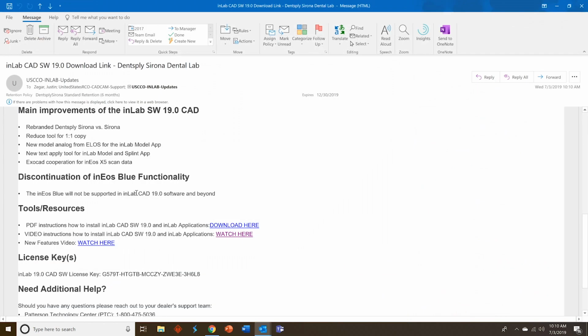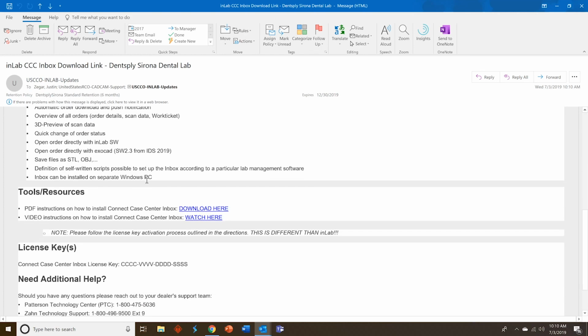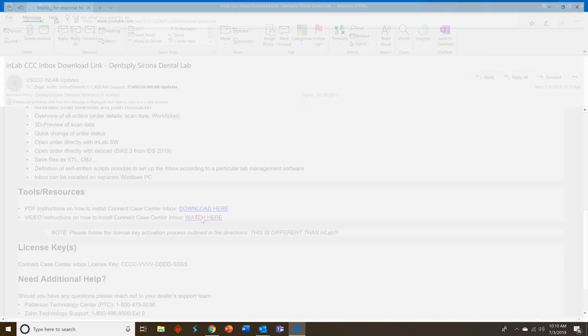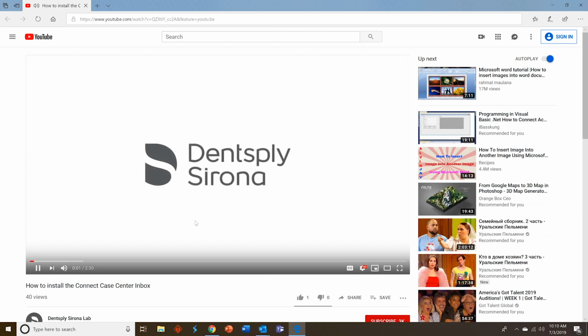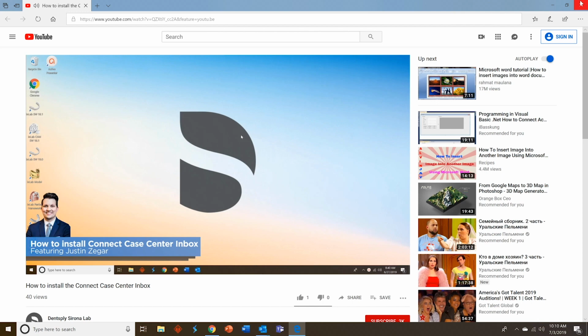We'll close that out. So let's go ahead and look at Connect Case Center inbox. Same thing, download link, license key, and instructions. And you can also watch a video on how to install Connect Case Center inbox. Once again, all of this is available on our Dentsply Sirona Lab YouTube channel. So we'll close that out.